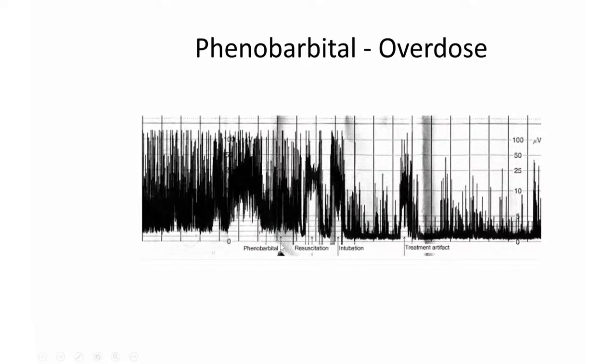So they loaded the baby with phenobarb right here. And then the baby had a complete flattening of the trace. The baby was receiving resuscitation. So this is not a seizure. This is artifact causing this increase. Then the baby was intubated. So again, more artifact. Then the baby was just being, what do you want to say?